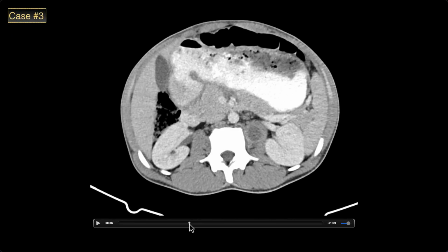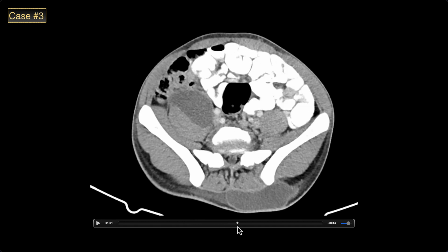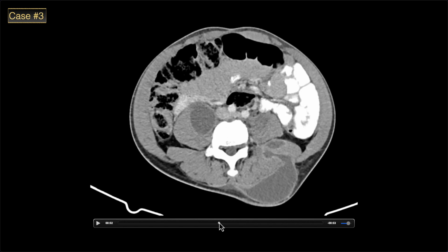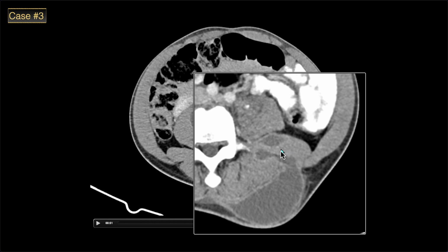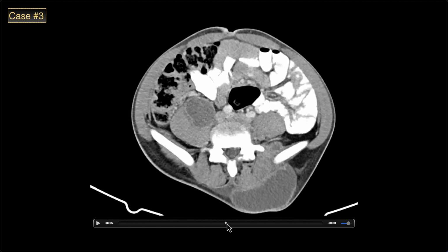The musculoskeletal system can be frequently involved with tuberculosis. And so in this patient, we are encountering some cystic collections within both psoas muscles and also decompressing into the posterior lumbar soft tissues. Here there's a tract where we can see between the erector spinae and quadratus lumborum muscles extending out and nearly rupturing through the subcutaneous tissues.